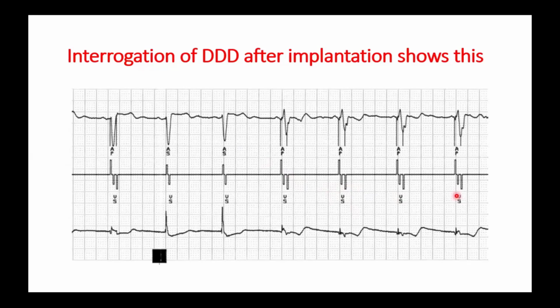It looks like the atrial lead is oversensing the ventricular, or the atrial lead is dislodged and is in the ventricle, so it's sensing the ventricular. Excellent, excellent. The atrial lead is actually sensing the ventricle. And here, when we reach the lower rate interval, the atrial pacing is delivered and actually captures the ventricle.